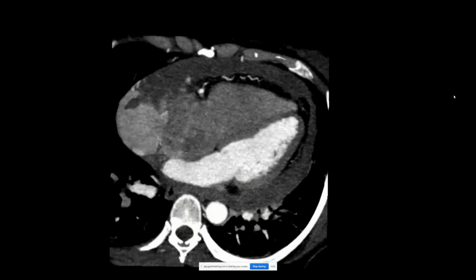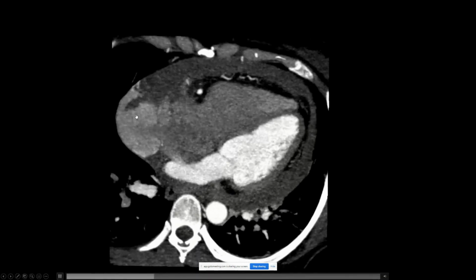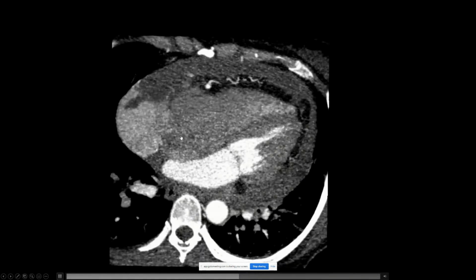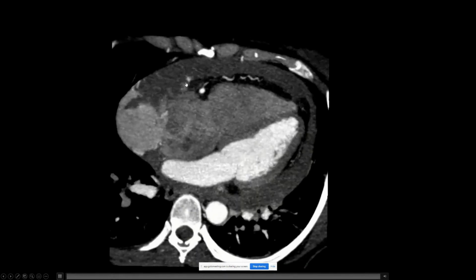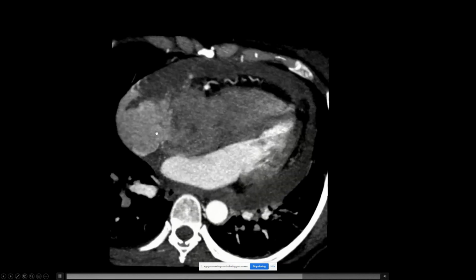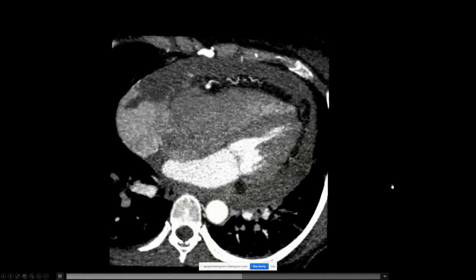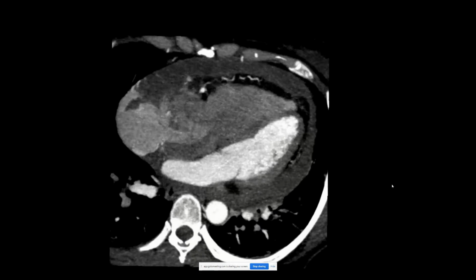Kind of interesting, huh? Just for comparison, here's an actual right atrial angiosarcoma, and you can see how much more evil this looks. It's kind of infiltrative and aggressive, and you see how much it enhances here in the early delay phase. And you can actually see tumor studding throughout the pericardial space, right? You can see the visceral and parietal pericardium with this slightly irregular nodular enhancement.